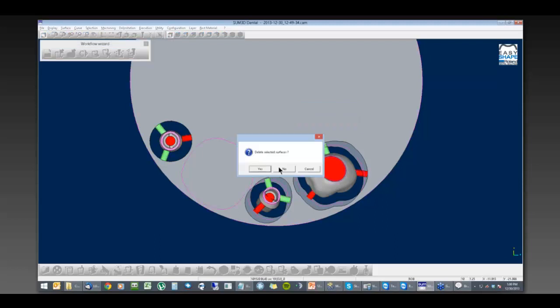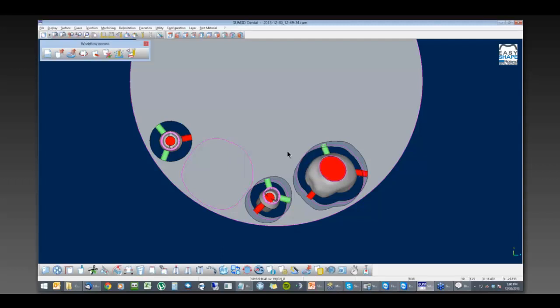Well, if you've got a full puck of these to actually process, you can select these in tandem together without having to go through and individually click those. So again, I'm going to go up to remove items. And then instead of going through here and individually clicking each connector, I'm going to go over here to the Select by Layer button and simply click on that.